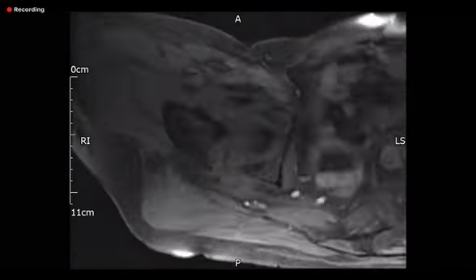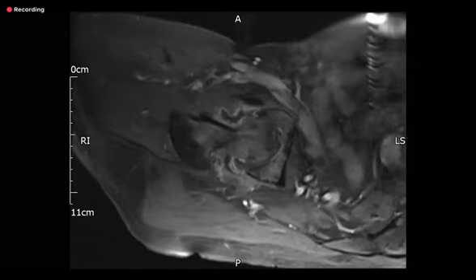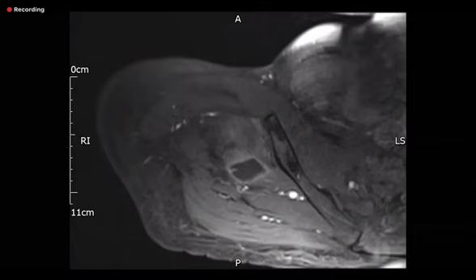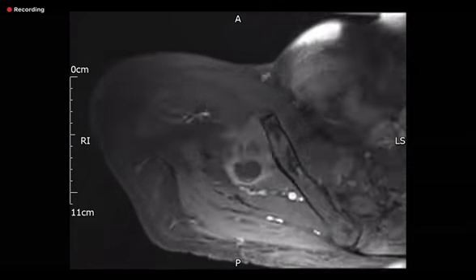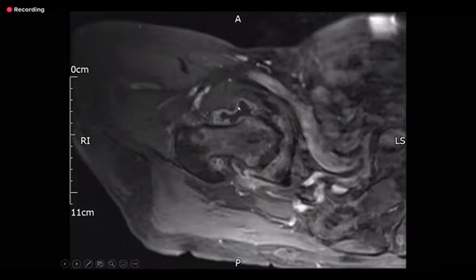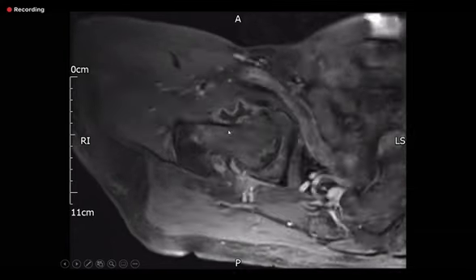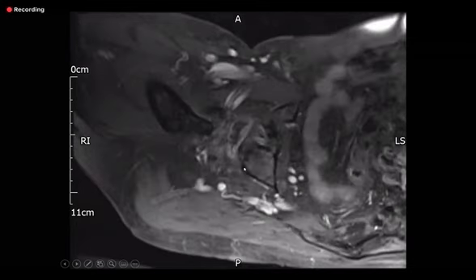Pre-contrast T1. Okay, pre-contrast. Saturated. Post-contrast. What's happening here? Oh, did I scroll too fast? Oh yeah. So I can see there's enhancing what appears to be a collection at the adjacent soft tissue. And also there is enhancing, is that a joint capsule? Yeah. So what is the conclusion? So overall finding is septic arthritis.